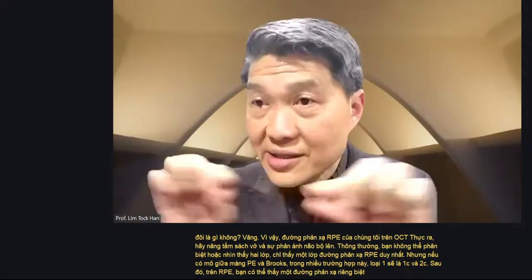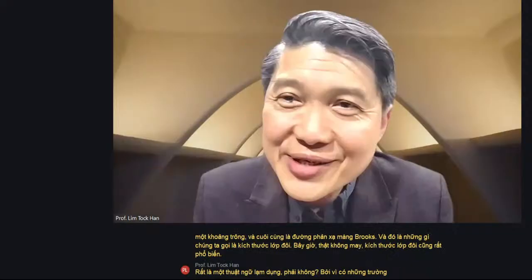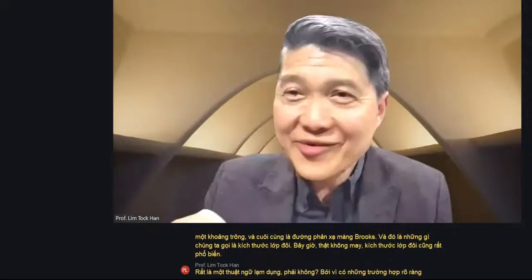Now, unfortunately, double layer sign is also very much an abused term, right? There are obvious cases of PED that are very far away from Bruch's membrane, but they are also described as double layer sign. Typically, if the RPE is just lifted away from Bruch's membrane with a very small gap in between, that's a typical double layer sign. And OCTA is very good at characterizing it.